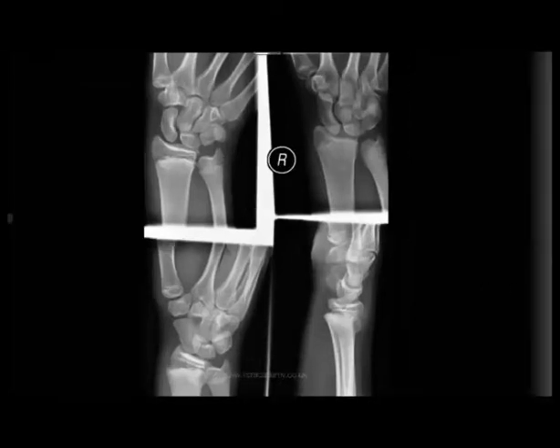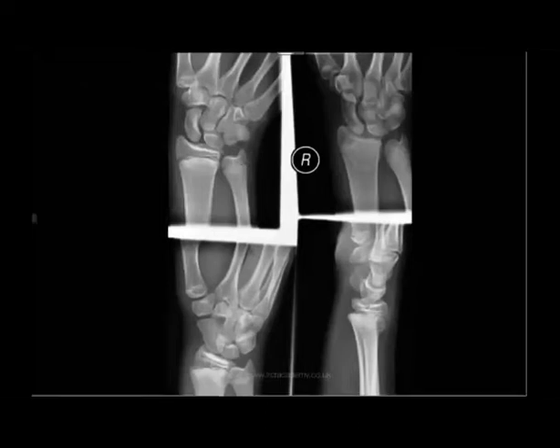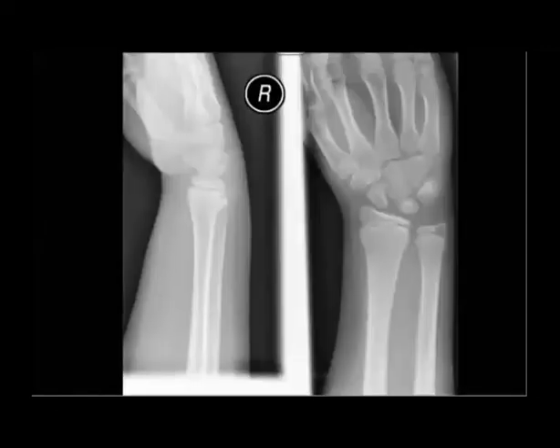I think if you go to the most common thing that happens in the wrist, you will find it. At least you can mention that it is a distal radial fracture. Yes. If you mention it is a distal radial fracture, this is very nice from you. Thank you. Our big stars. Nice.